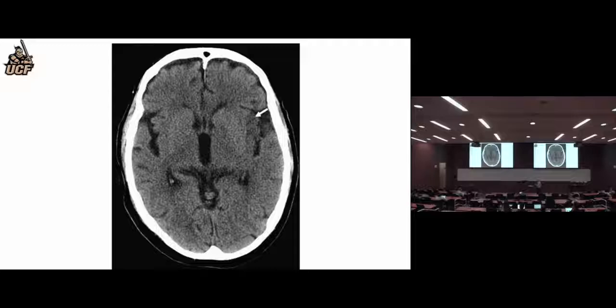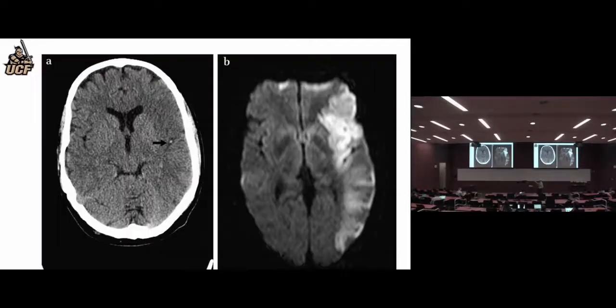So subtle evidence of edema. If we put something like this on a test, I would try to have some clues to clue you in that you're supposed to look for some subtle signs of edema. Try to make it reasonably doable. I don't want you to think I'm going to put something on there that is unnecessarily tricky. Inevitably, whatever's on there, somebody will find it unnecessarily tricky, but hopefully most people won't.